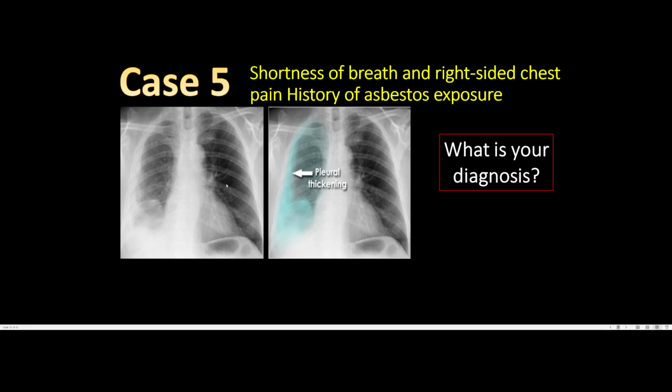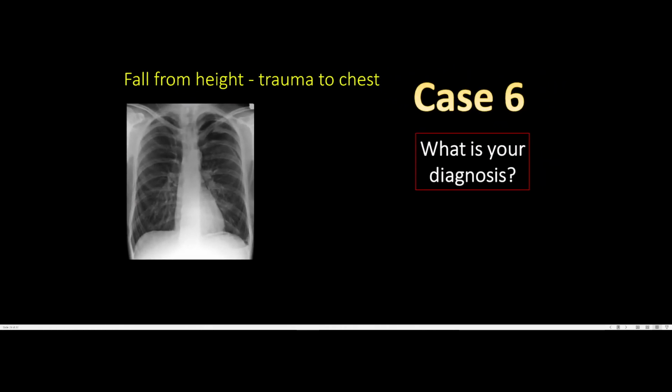So you might look for pulmonary nodules, which is not found in this chest x-ray. But again, never stop at an obvious finding. Keep continuing your search at other areas. All right. So that's the idea behind the case.